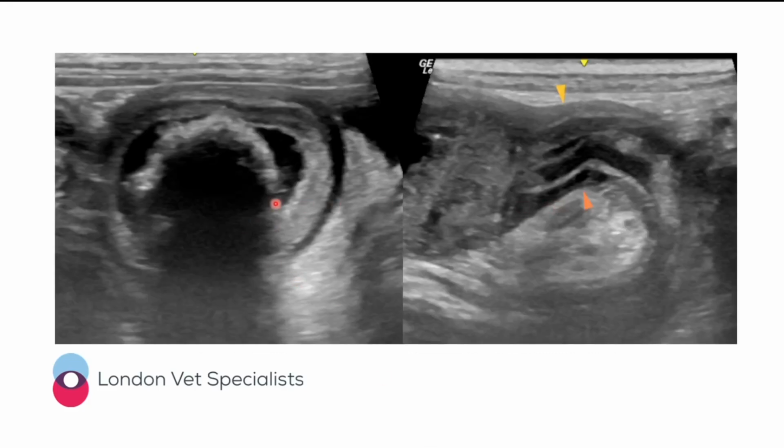In terms of the appearance of the bowel ORAD and ABORAD, this material here is effectively an ultrasound gravel sign. So if you think back to evaluating abdominal radiographs, if you see a gravel sign, which is an accumulation of mineralized material within the small bowel, then that's compatible with a chronic partial obstruction. And here we've got an accumulation of shadowing material, just ORAD to this partial obstruction that's being caused by this intestinal carcinoma. So this is essentially what a gravel sign looks like on ultrasound.